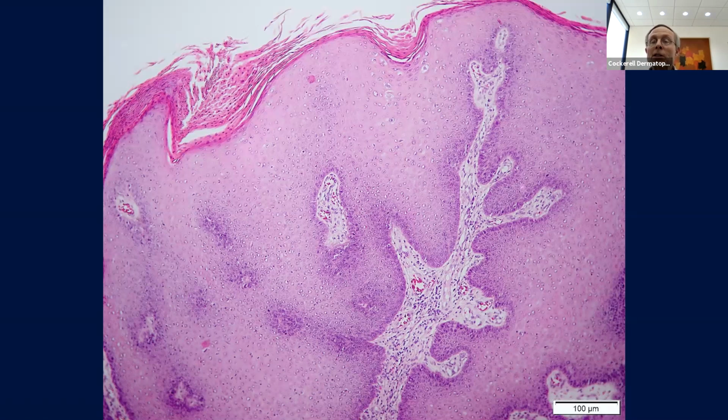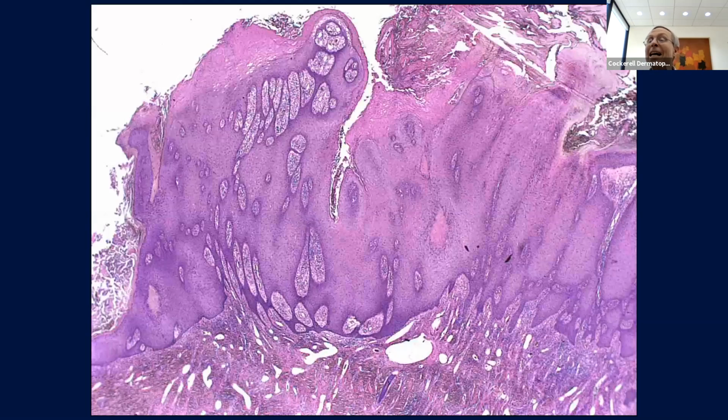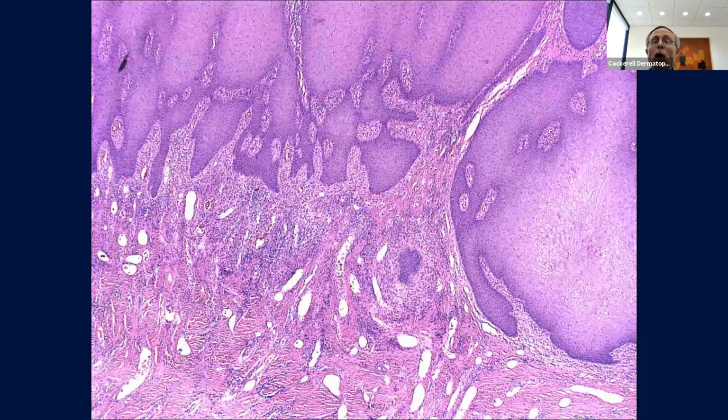It's a verrucous carcinoma. It extends deeply. The cytology of this thing is totally bland and benign, and they don't have to have a single mitotic figure. They don't have to have any atypicality. It looks just like a wart. And just like dermatofibrosarcoma protuberans is malignant because it has a very large diffuse extension, this lesion is also malignant in the same fashion because it gets deep. And these things go way, way deep. They'll get down into the tendons, into the bone.